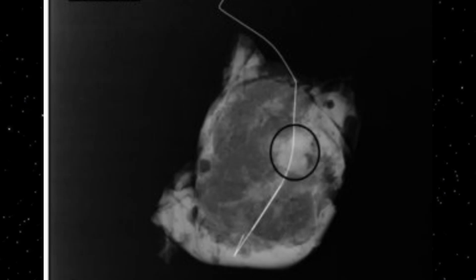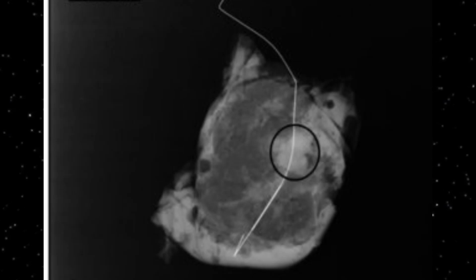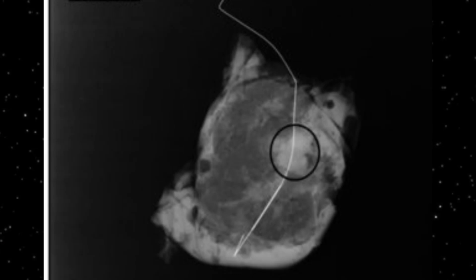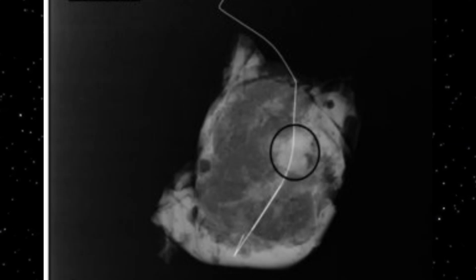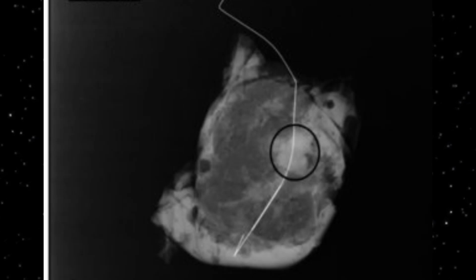For that purpose you have to look for the accuracy of the wire localization of non-palpable lesions. You have to put the wire, and then it will help you to localize the lesion in the true lateral view, which is a supplementary view.